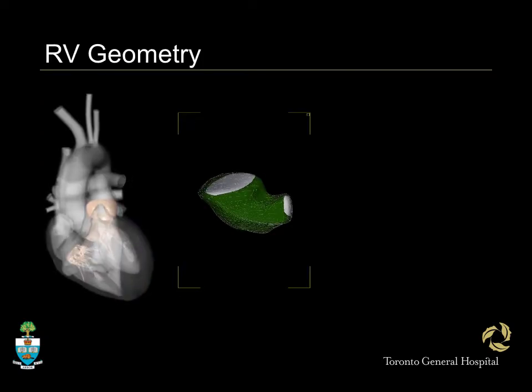RV strain. So as you all know, and we've learned a lot from 3D echocardiography, the geometry of the right ventricle is extremely complex, and this is a rendering from a CT scan. We built this moving heart, and in the center is a 3D reconstruction of the right ventricle from echo. You can see that it's a very uneven shape, extremely hard to reduce to a simple geometrical piece. So using limited slices to reconstruct the whole volume is impossible.